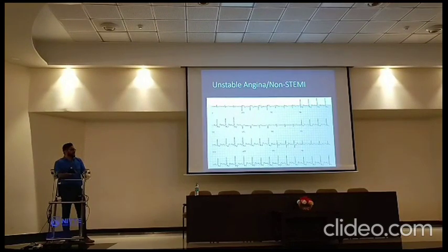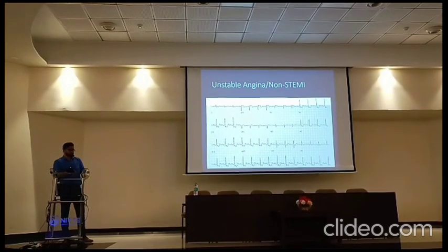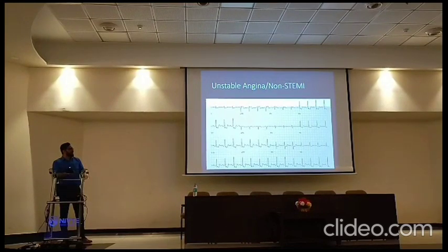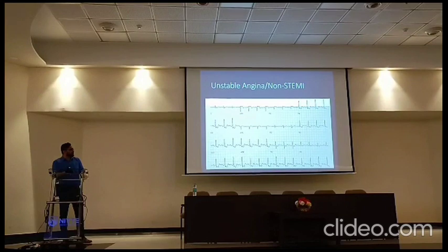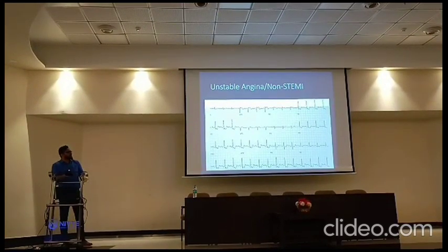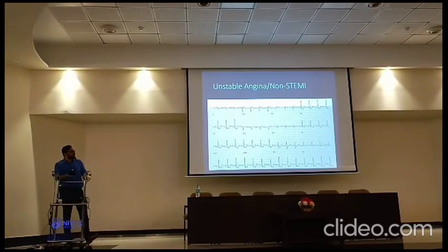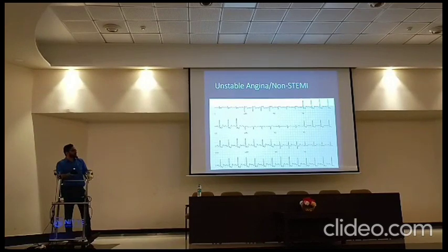This is the QRS and this is the T. This is the S wave, as you are aware. This is your P wave. Then, in some people in some leads you can see one P, one Q. Then you get this R, then S. Then you get a T wave, and this is the ST segment.